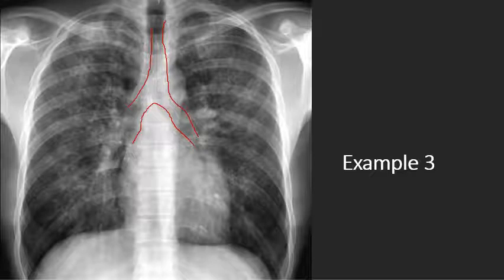Take a moment to think about what this can be. This diffuse ground glass appearance everywhere. That could be viral, it could be fungal, bacterial. If you said PCP pneumonia, you are correct.